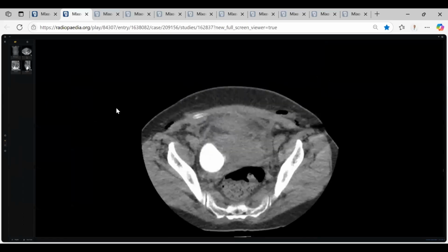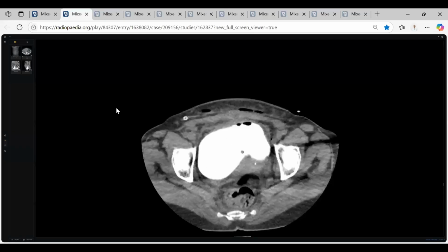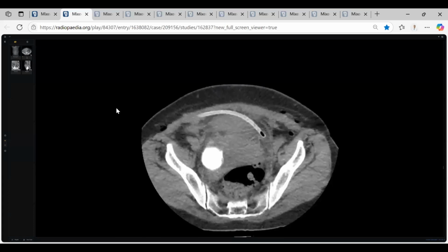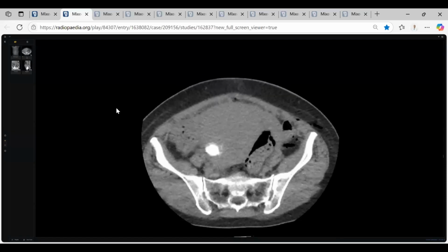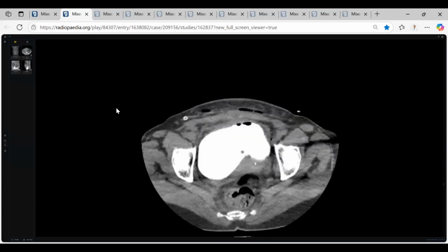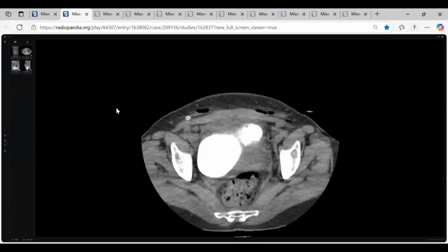Sir, I have been presented with a CT scan axial section with ascending CT cystogram, in which I can see the Foley's catheter in situ along with contrast, and there are a few air bubbles. The uterus is edematous and large, likely secondary to the delivery. I am not able to visualize any fistulous communication with the bladder, and no extravasation of contrast is seen.